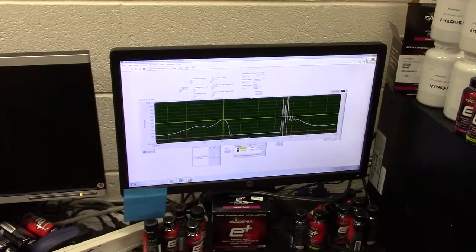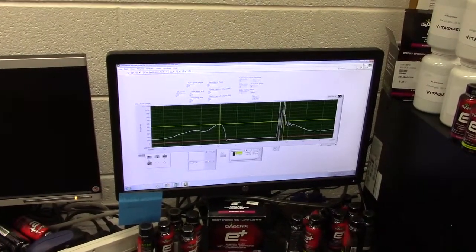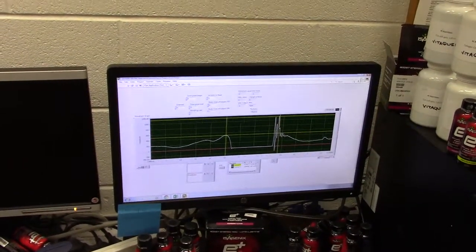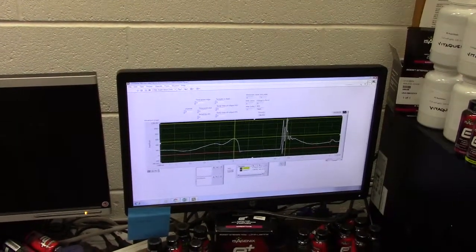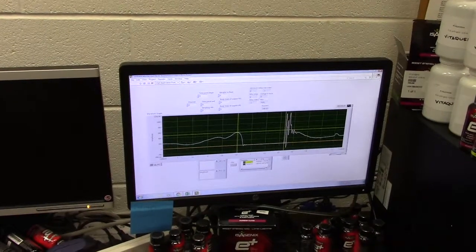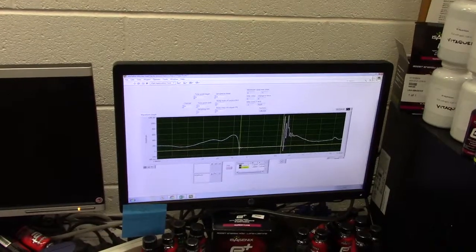So if we're trying to find the flight time of the individual, and actually we're going to have a little fun here, make sure that we get to the top of that, move our cursor tool over, and that's actually going to be his true peak. Now in order to get flight time, your flight time turns out when you're in the air. So that's the point where we go through 0 and come back down through 0.